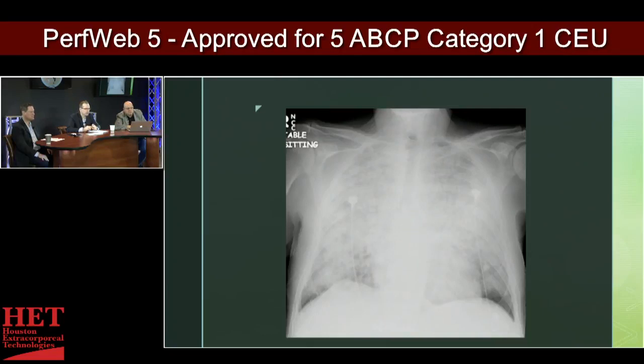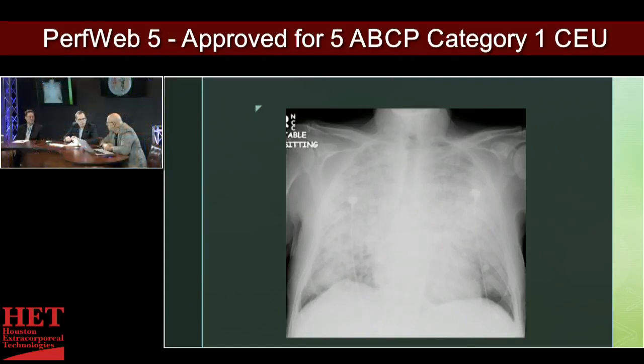But given this setting, this is probably an elderly patient with long-standing heart disease who has developed ARDS. The cardiomegaly in and of itself is significant, but you have to put it in the context of the patient you're seeing. They may have had cardiomegaly for years, asymptomatic. So it's not necessarily an acute thing. Oftentimes an enlarged heart shadow is not an acute process because the pericardium is a confined sac, and it's pretty fibrous in its nature. If you have an acute process that puts fluid there, they're going to come in because of tamponade rather than just an enlarged mediastinum or heart.